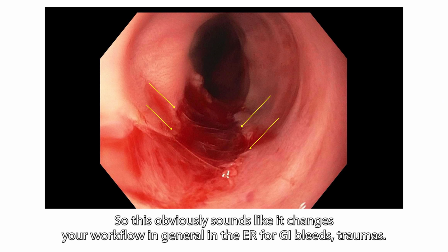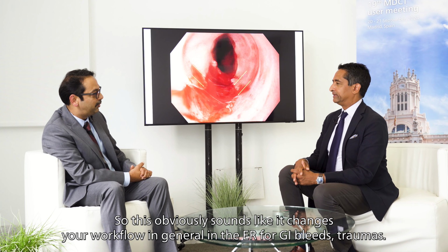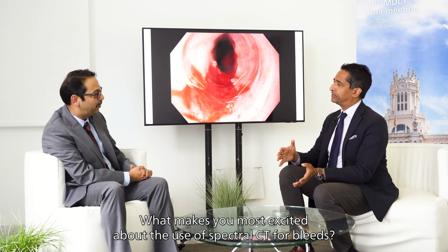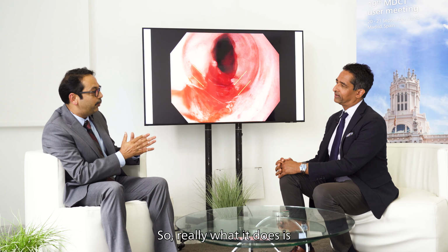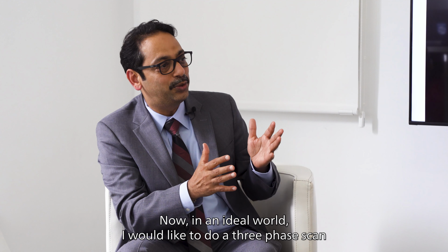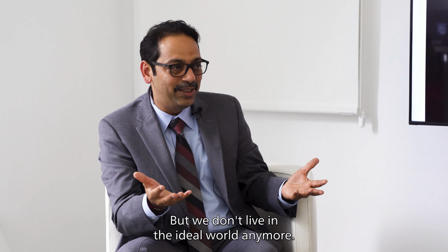So this obviously sounds like it changes your workflow in general in the ER for GI bleeds, traumas. What makes you most excited about the use of spectral CT for bleeds? So really what it does is it lets us make the diagnosis on the one scan the patient got. Now, in an ideal world, I would like to do a 3-phase scan with a non-contrast arterial venous phase, but we don't live in the ideal world anymore.